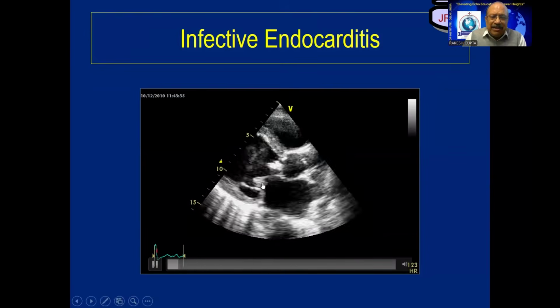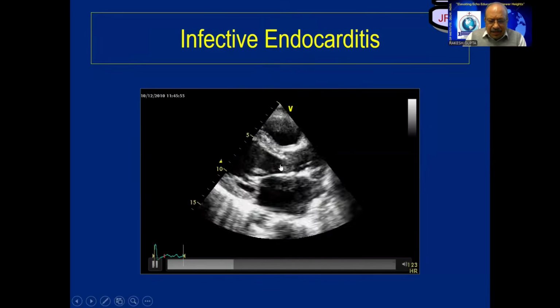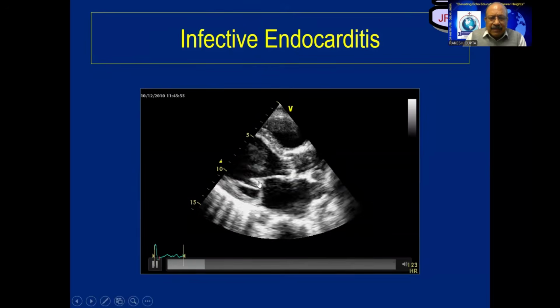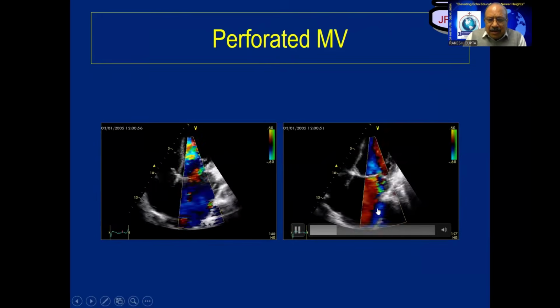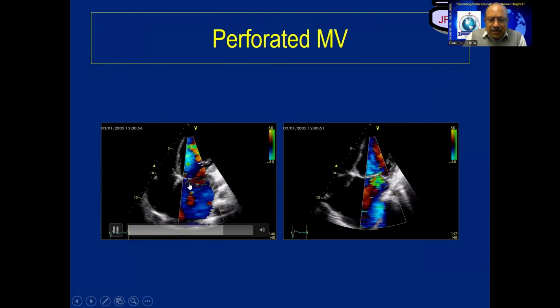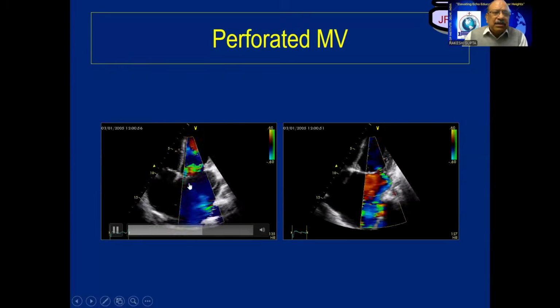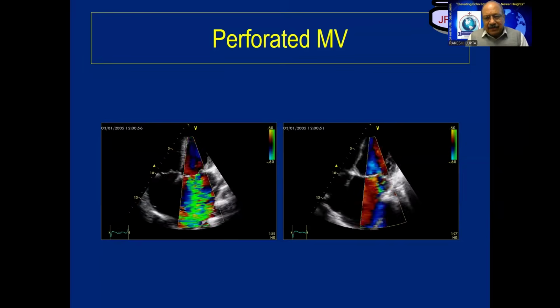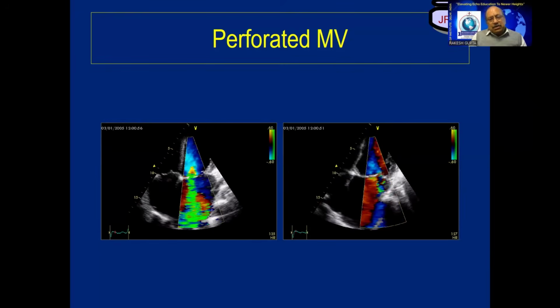Now, again, example of healed calcifications. You can see AML, you can see aortic valve and mitral valve. This is perforation of the mitral leaflet. Look, the coaptation line is over here, severe MR. But at the same time, you see another jet originating from the AML. And these pictures are virtually from our own labs; we have not borrowed them from anywhere. And this is what needs surgery. That is the difference when we look at etiopathogenesis.